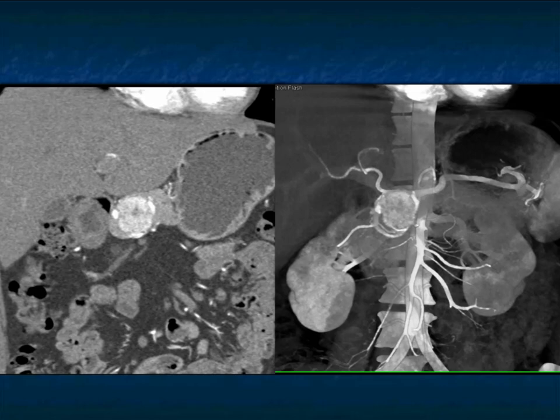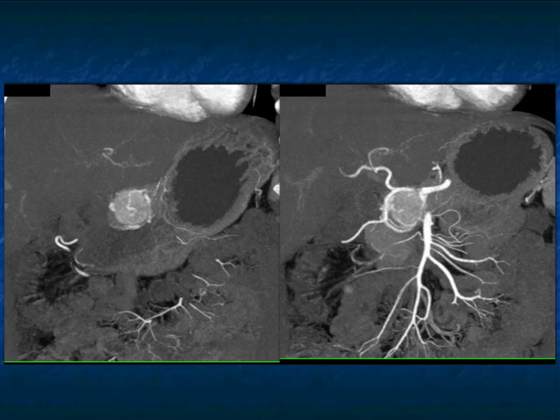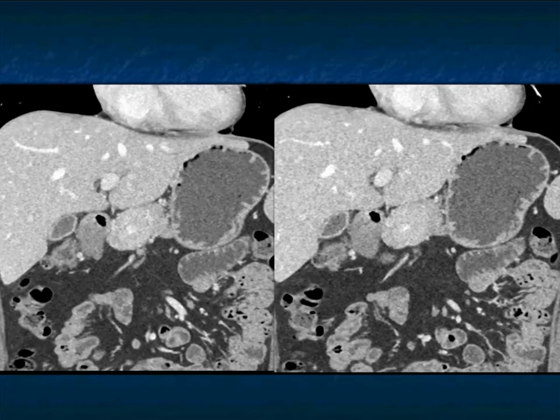And here's the vessel where there looks like some draping of the vessel. So you might be pushed or at least think about a serous cystadenoma, but I don't think you really would be thinking about that. Surely with the second lesion present and its appearance, I'm sticking with neuroendocrine tumor over a serous cystadenoma. You can look at the washout. The lesion washes out. You see some cystic component centrally, but you're not seeing a large cystic component, and you're not seeing any more of the changes you might expect to see in a patient with a solid serous cystadenoma.